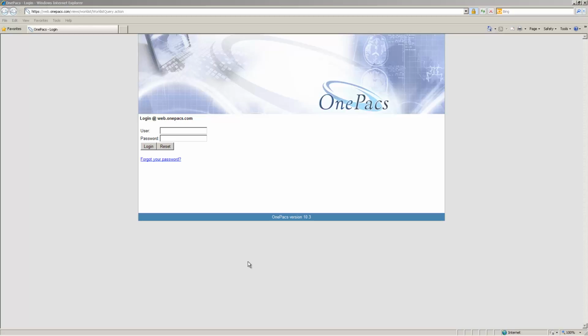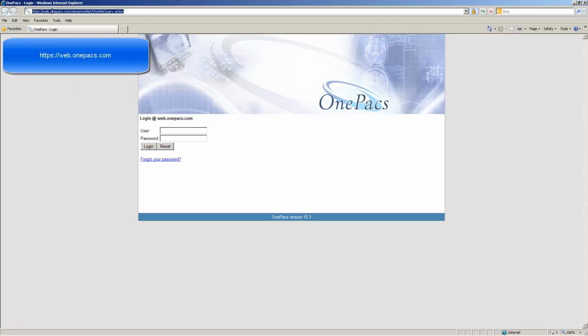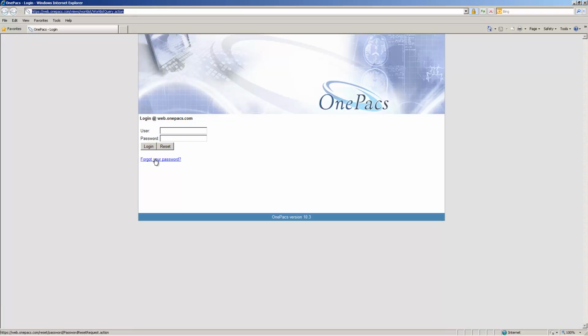Hello, this video will give a clinician a brief training of the OnePacs system. To start, open an internet browser and go to web.onepacs.com. This will bring you to the login screen.